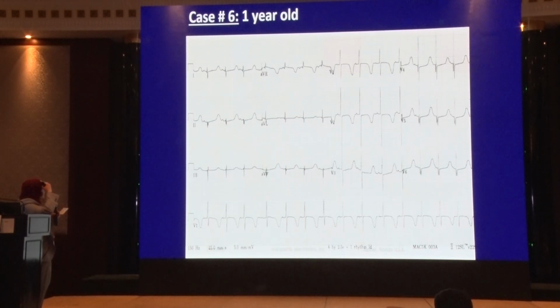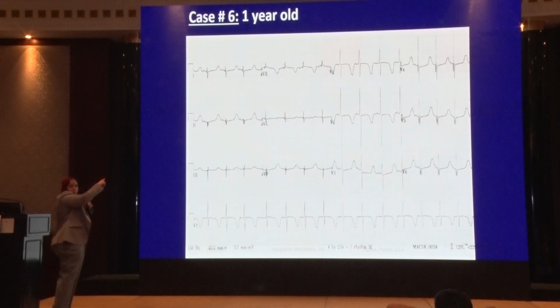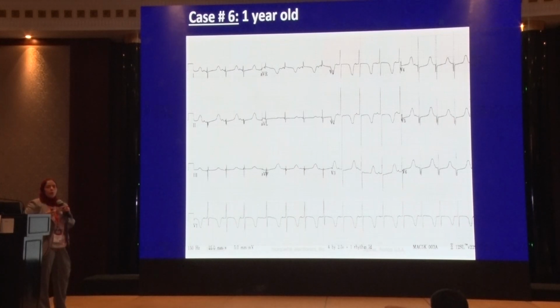Okay, so is he in a normal sinus rhythm? What do you think about his PR interval? Normal? Okay, we will see it. What do you think about his P waves? Normal, huh? P waves, we will comment on the P waves in lead 2. We'll find it normal.